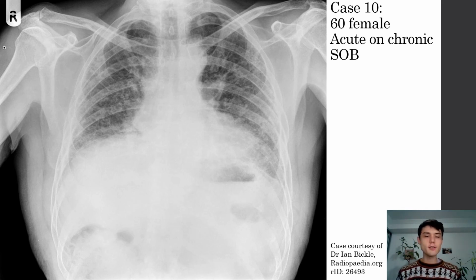And we also notice that although usually we would want an inspiratory X-ray, this is very poor inspiration. And here we can actually only see 4 anterior ribs, where it would be normal to have 6 to 8 anterior ribs and a good amount of inspiration. So both the reticular pattern of opacification and the poor inspiration is suspicious of interstitial lung disease.